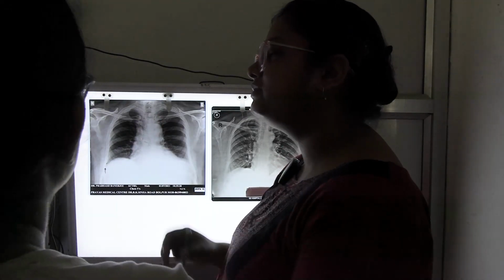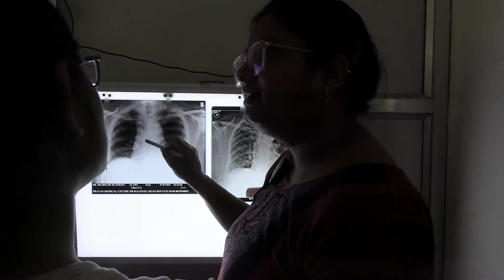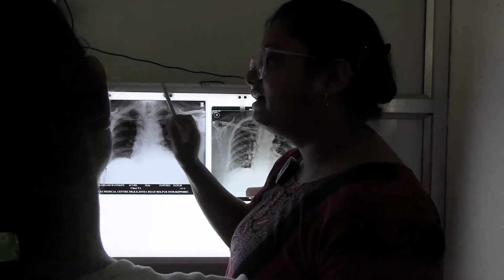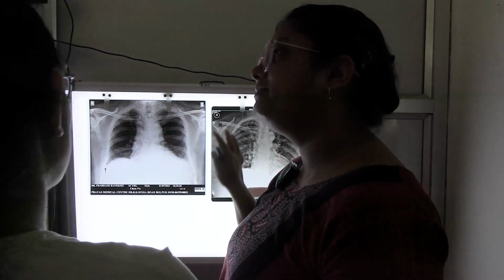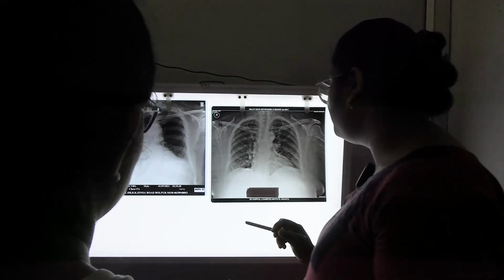In pneumothorax, it will push the lung towards the hilum of the lung, and on the lateral side where the air is lying, there will be only black shadow; no bronchovascular markings will be visible. So, that will be the difference.